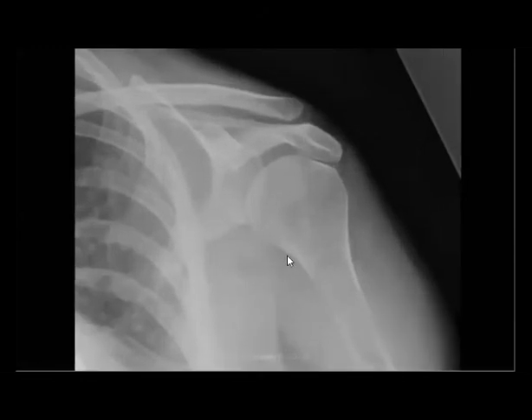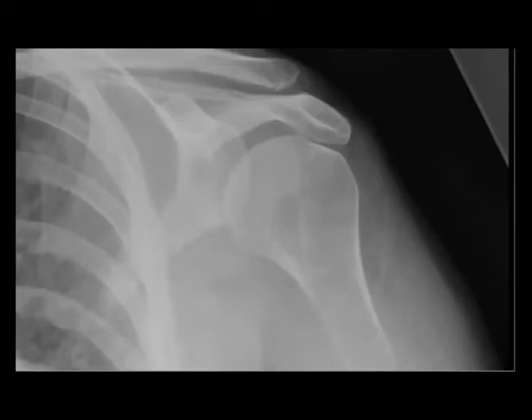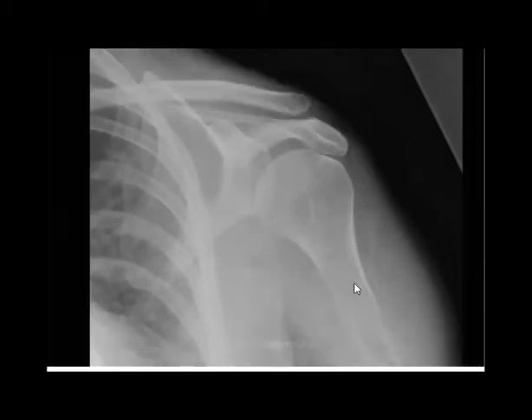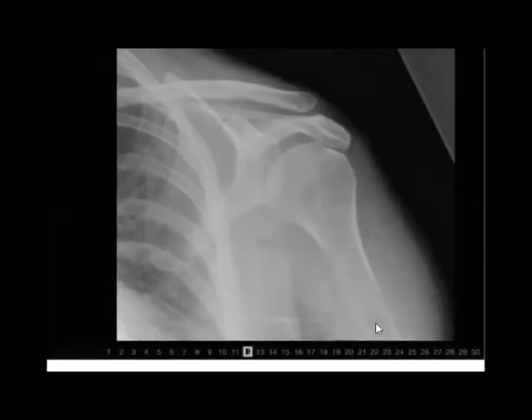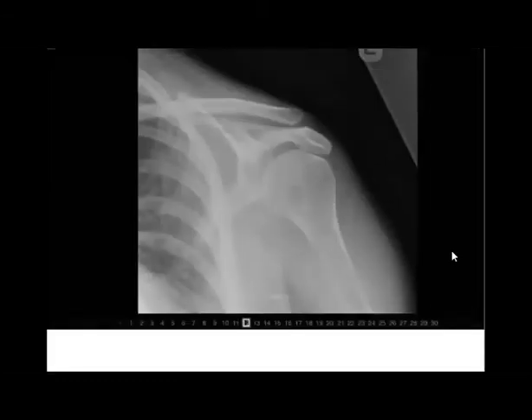This one is not easy because I think you need zooming, so that you suspect there is a lytic humeral shaft lesion. You will see the end of the film, the edge of the film down, maybe you can see something here. Maybe it's not very easy, but yeah, you can see even the periosteal changes here, and there are soft tissue changes. Yes. Is it clear?